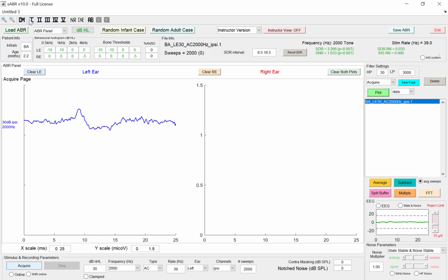We've changed the markers a bit. We still have cochlear microphonic and waves 1, 2, 3, 4, and 5. We added this no response marker and a could not evaluate marker, and this is still our text label. With the markers, I'm just going to go ahead here and mark wave 5, and we can click and drag that over. What you'll see is it will update the latency at which it is occurring. You can also click the prime value. It shows the latency there and then the peak-to-peak amplitude in the brackets. And we can click and drag that anywhere.